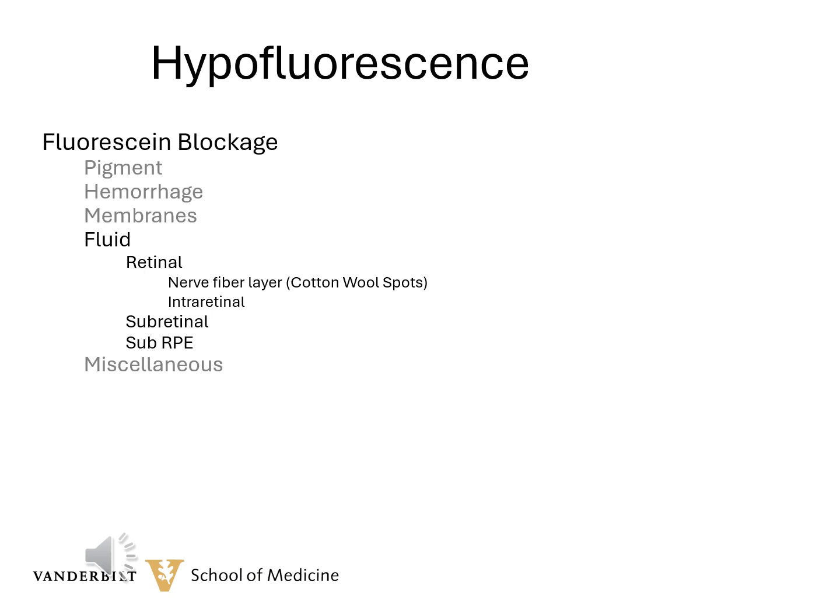Abnormal fluid can occur at different levels of the retina. Just as with blood, they will have a different cause and a different clinical appearance. The edema may be bright white, as in the case of cottonwool spots, or have a creamy color for deeper retinal edema, or a clear elevation of either the neurosensory retina or the RPE, as in cases of central serous or pigment epithelial detachment. If there are inflammatory lesions, there may be a thick subretinal exudation, and that can also look creamy or yellow.